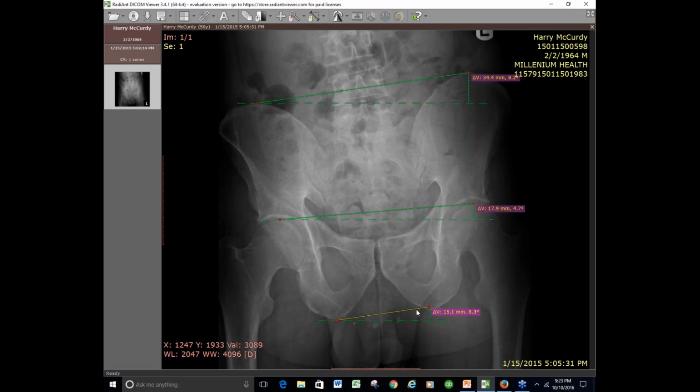So I need those two right triangles to be exactly the same in the angles that they project, these angles, right? And the way I can do that is to set that up down here to match up there. And then I know when they sit, right, because I basically need this line and this line to be parallel. And I just made them parallel.